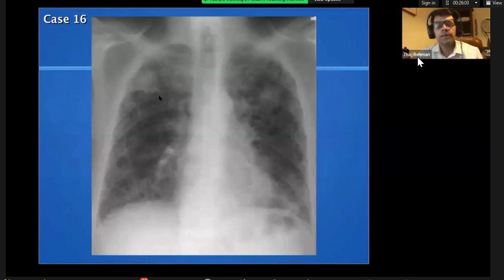So connective tissue disorders, UIP, always look for connective tissue disorders: clues for rheumatoid nodules, clues for systemic sclerosis, clues for previous asbestos exposure, clues for previous exposure to chemotherapy. There may be a mastectomy or axillary clips.